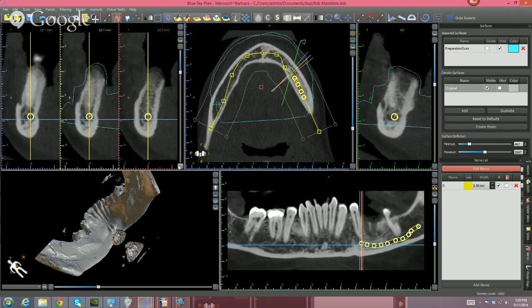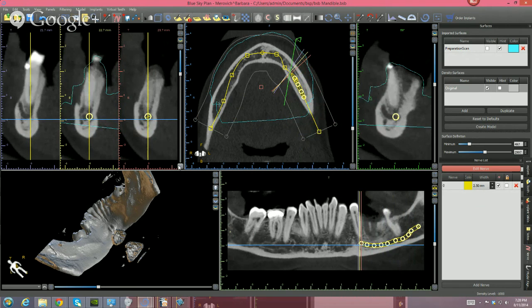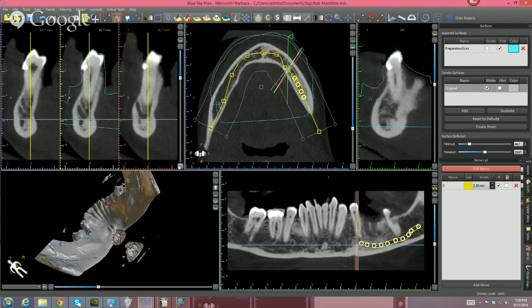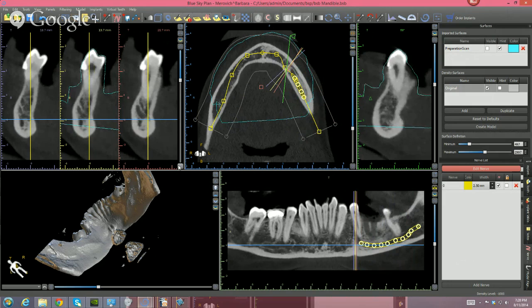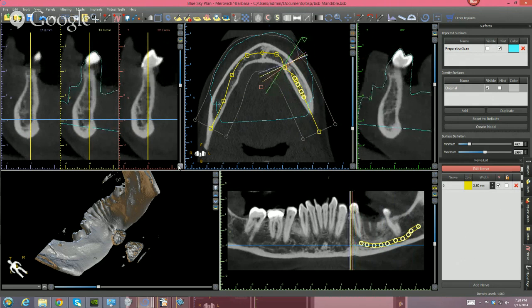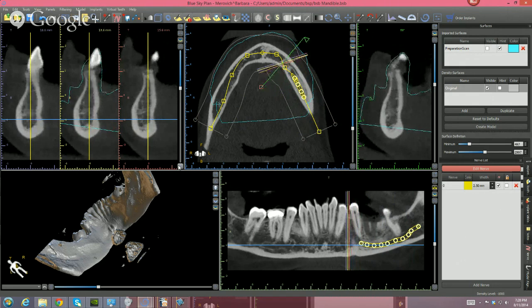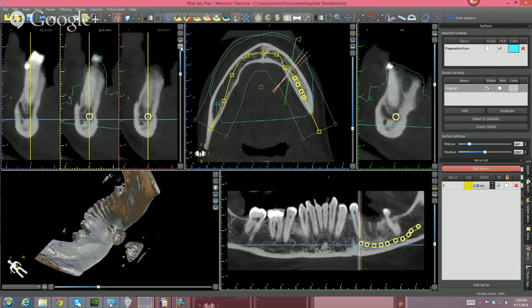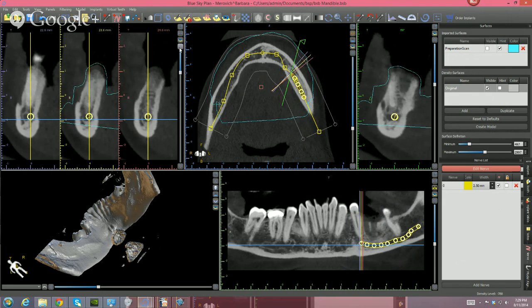So what I'm going to do over here is advance my image a little bit and see if I can see its exit. For some reason, I can't make it out very well. Actually, this is very good because I'm not seeing it very well. Let's go backwards a little bit. Somewhere over here is the exit. And I think it's so skinny that this is part of it coming out, and here is the rest. So let me trace it back a little bit. Okay, and let me go forward a little bit.